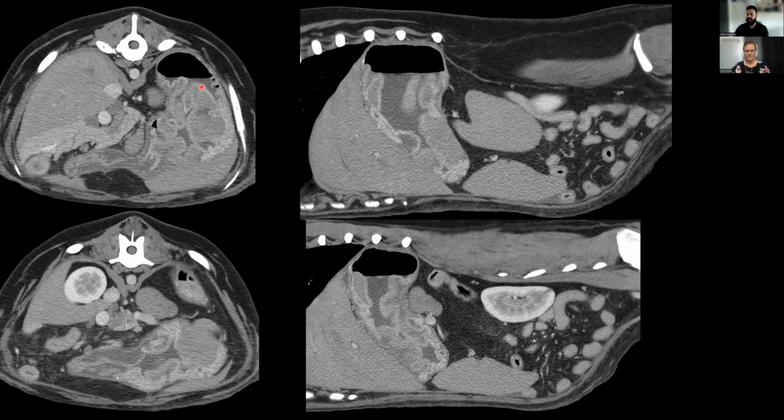We've got changes to the gastric wall, which is this organ here. We've got our gastric outline here, and we've got portions of the gastric wall that are quite thickened relative to what they should be. This area here is also kind of a mass-like lesion in the gastric wall and along this margin here. And then the spleen itself is quite large, and we've got some lymphadenopathy in the abdomen as well. So I'm going to draw that very quickly. The stomach is this portion here.